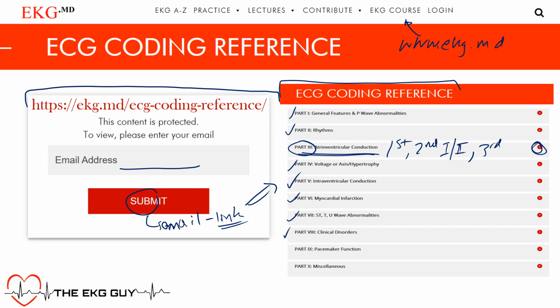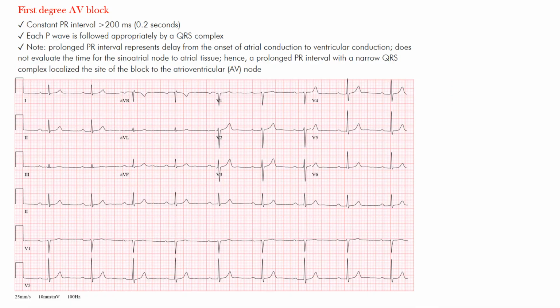Well, let's start a review of the AV blocks. So first degree AV block, what's going on here? Well, this is a minor AV conduction defect. This is a partial block at or below the AV node.